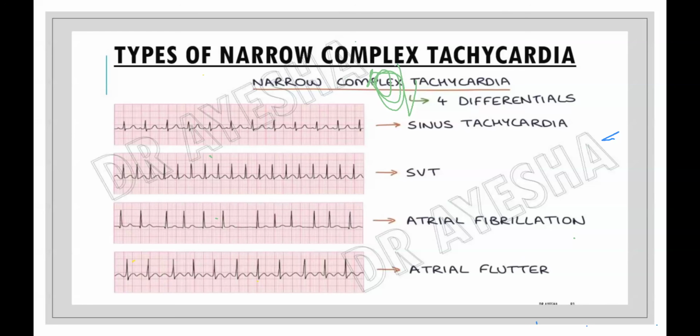Okay, atrial fibrillation में fibrillatory हो रहा है, पूरे एट्रियम में जगह जगह से फिब्रिलेशंस हो रही हैं, जगह जगह से यू कैन से इलेक्ट्रिकल एक्टिविटी हो रही है और आपको एसवीटी और एट्रियल फिब्रिलेशन इन दोनों में पी वेव्स नहीं होंगी। प्लीज गौर से सुने बात, एसवीटी और एट्रियल फिब्रिलेशन दोनों में पी वेव्स नहीं है। हाउ यू गोइंग टू डिफरेंशिएट बिटवीन देम?